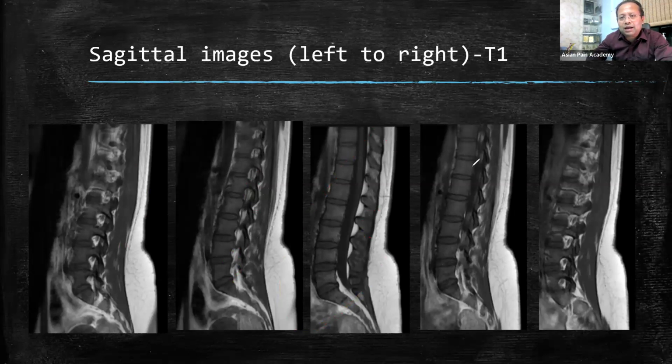But here you can see the spinous processes are not spinous processes, also not coming and joining over each other. So what can it be? Somebody tell me, what is this? Any idea? You can see bone pieces like this.